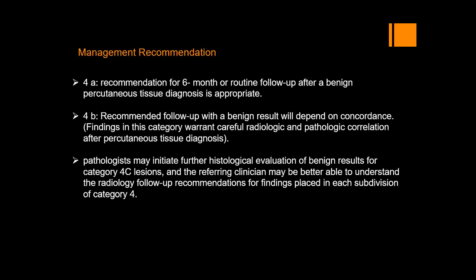While for 4B and 4C, the level of suspicion is a little bit higher, so you have to look at the image and the pathology result to see if they are concordant or not.